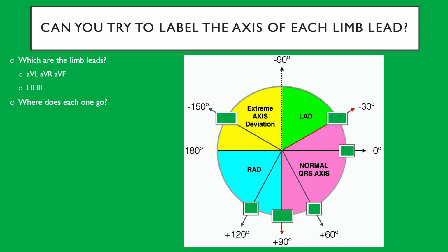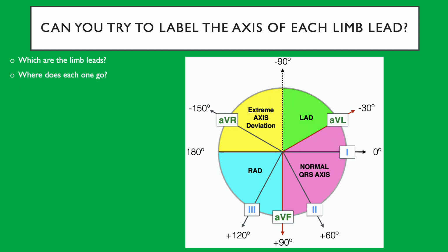That's why we always do number 2. From anatomy, the heart is on the left and a bit downwards. So on the left and a bit downwards, that's number 2. That's why you look at number 2. It's the most physiological. So this is number 1, and this is the one that is left. Good. So that's your axis, and just revise it a bit, so you know your things.